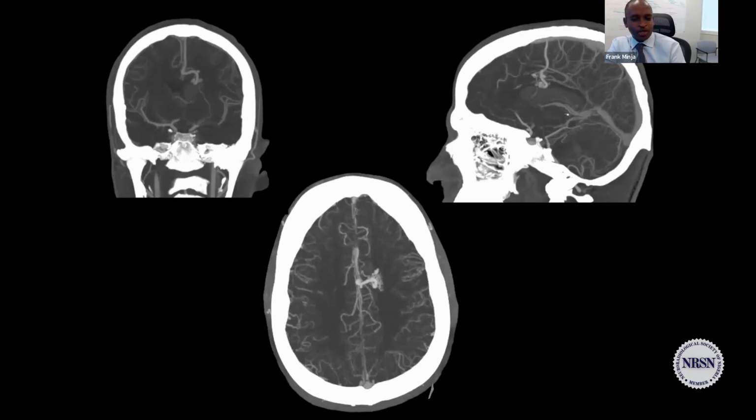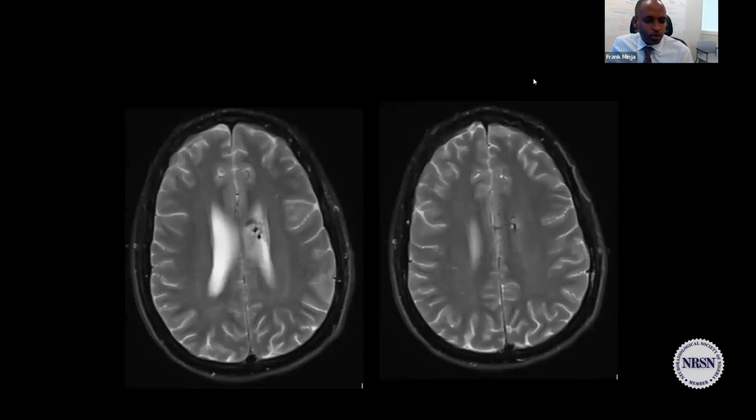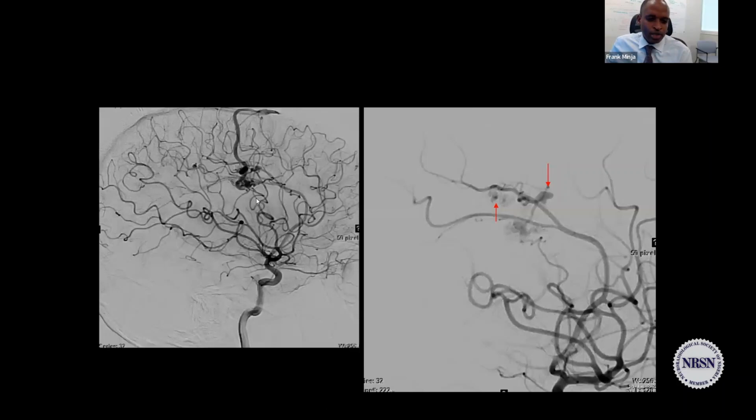What are the choices, right? There's rupture. Rupture of what? AVM, right? Do you see the intranidal aneurysm? See that little dot? Here's the nidus, and then we have these intranidal aneurysms. So they go in on MR. You can see those little intranidal aneurysms. It's kind of really cute. And then voila, on the angiogram, you can actually begin to see.